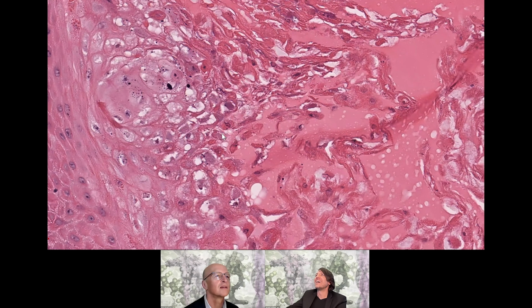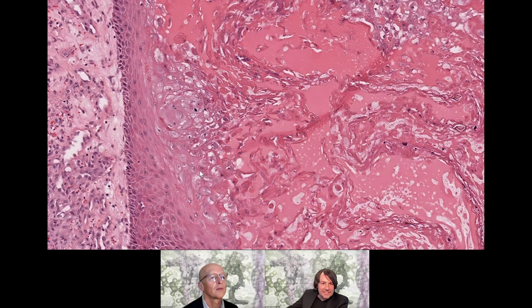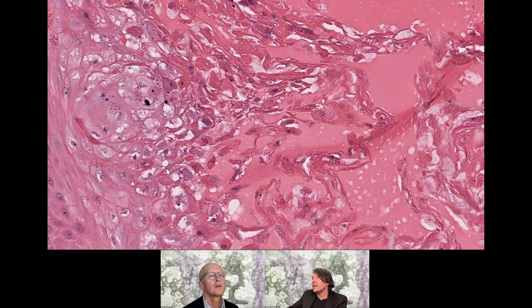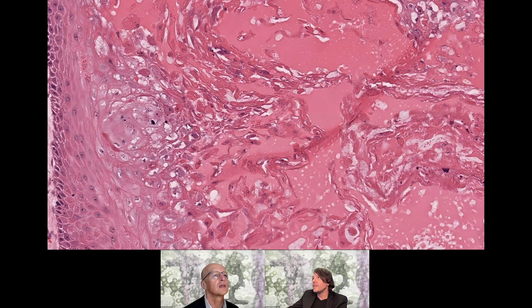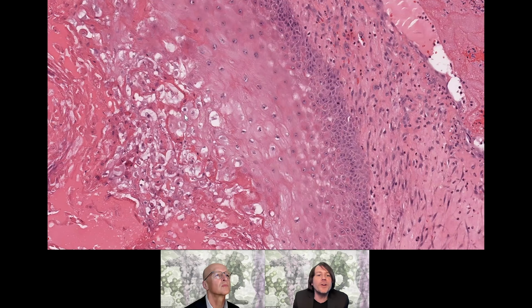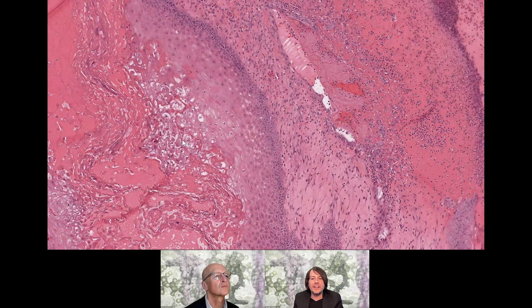Yeah, so here I think what you are referring to is the squamous lesions, how do they look? The cytology. Is there anything abnormal there? There's kind of smudgy nuclei, I guess. That's the key here, perhaps, right? And then there's some little, well, I don't want to give it away. I want to see if anyone knows what it is here.